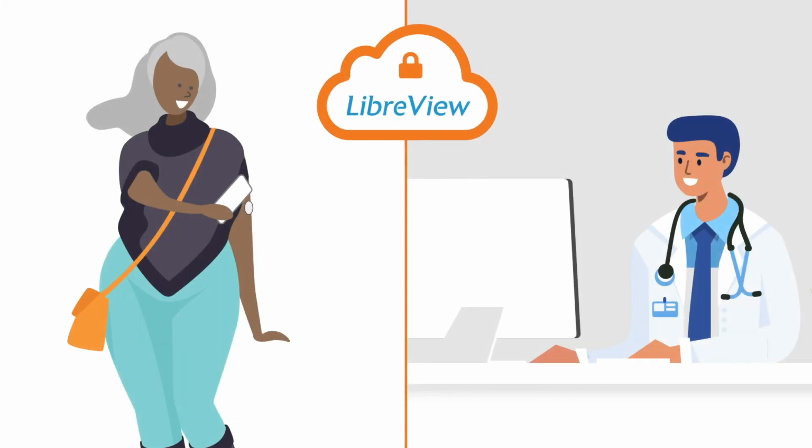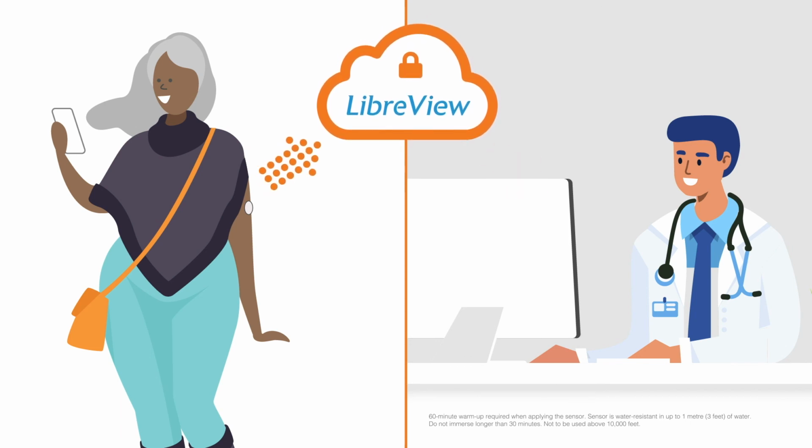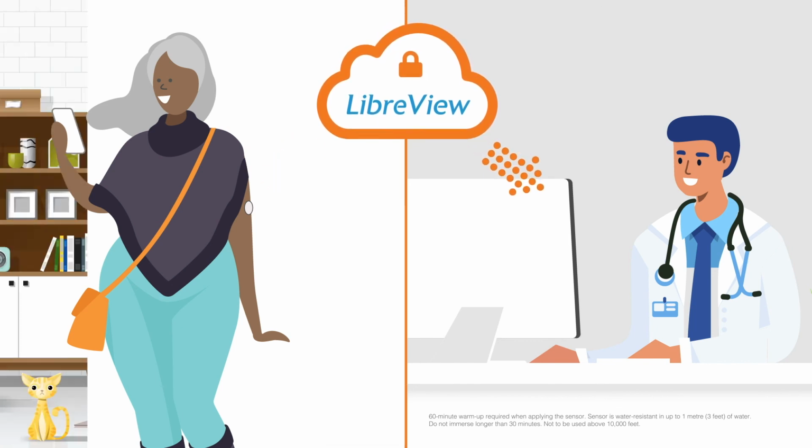Congratulations, you're ready to start sharing your glucose readings. Needless to say, the FreeStyle Libre system was designed to enable more productive conversations about diabetes management at any time from anywhere.